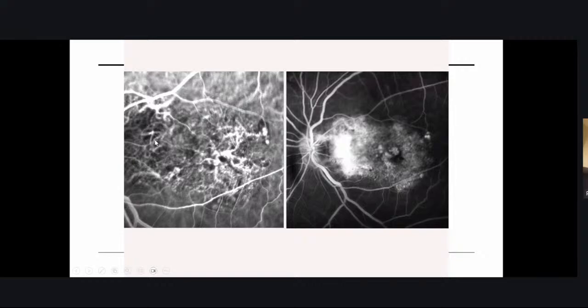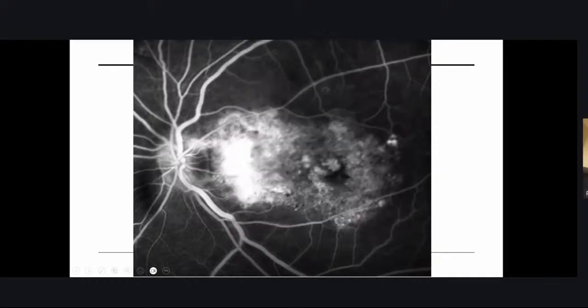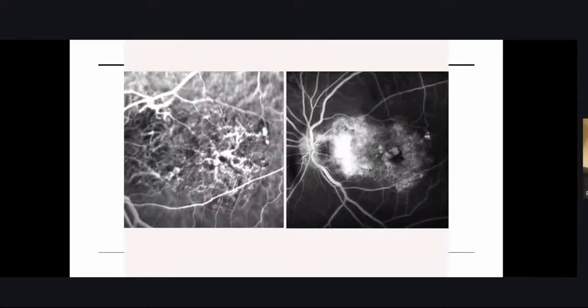So for example, this patient would just need anti-VEGF treatment. And if you can, just use laser to photocoagulate this polypoidal lesion. So this can tell us where the troublemaker is, and we can treat accordingly. Now, if you juxtapose this to the FA, you can actually see how it lined up very nicely. You can see the lesion.